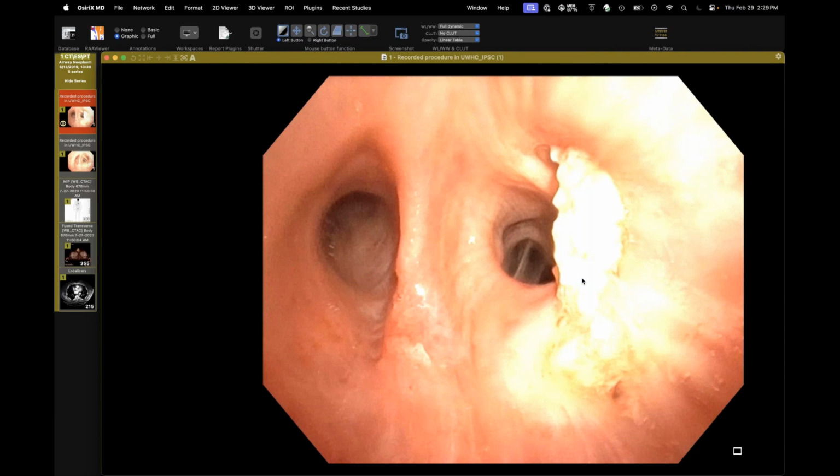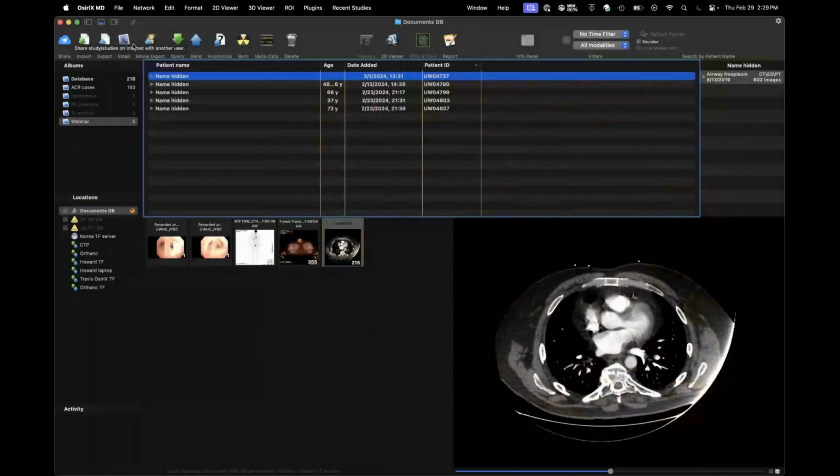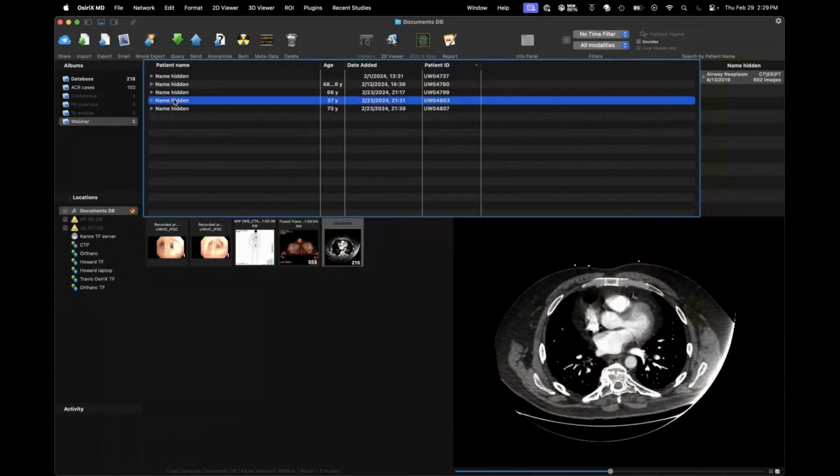These are sort of like the old pseudotumors. The now preferred name for them is inflammatory myofibroblastic tumor. They're not neoplastic or malignant in a sense, and it was removed bronchoscopically. So it wasn't a metastasis, but in this particular case, the diagnosis was challenging because it had some morphologic features similar to the original melanoma. I don't have the path to share with you, but there were all these different stains you can do to work it up. Interestingly, we got a second case on the other side.